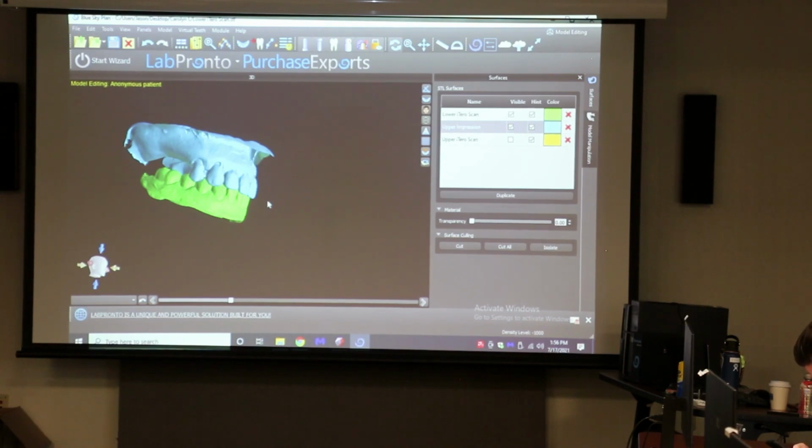This one? Yeah. Okay. Yeah. There you go. That's the quick and dirty version. I like it. So you just did 3 points. There you go. And now it said, okay, took that green and it stitched it to the blue. And you can see the overlapping of colors, so you feel good about, okay, it's close.